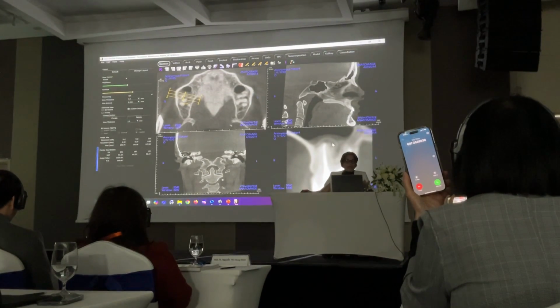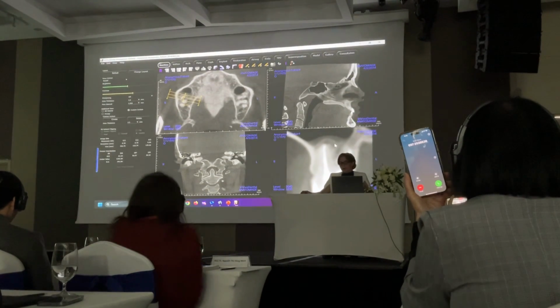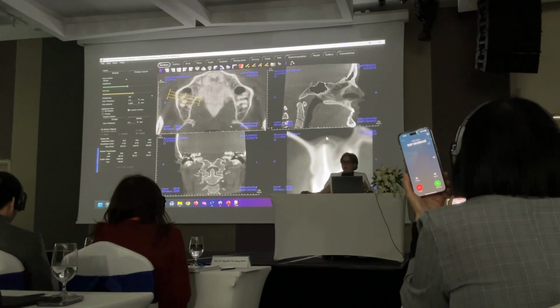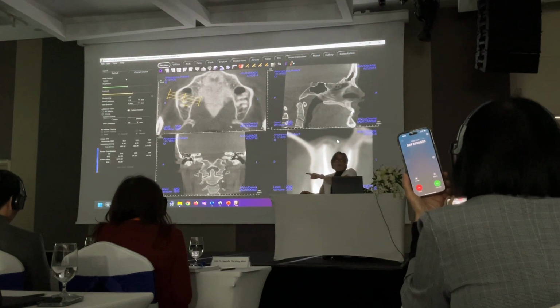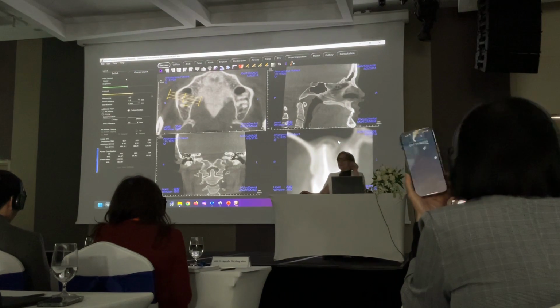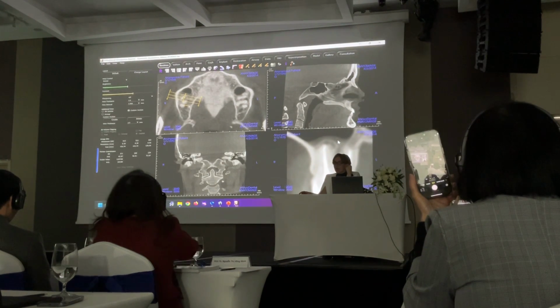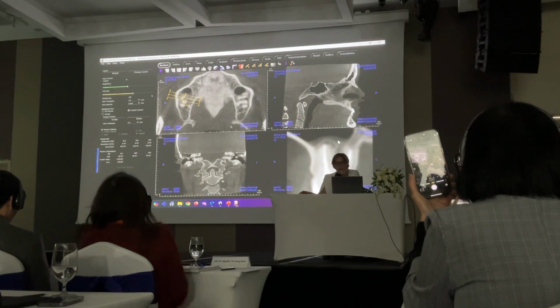New, maybe it's healing. This is lifting the floor of the maxillary sinus. And there is a secondary inflammation of the Schneiderian membrane, okay? This is an important diagnosis for all of you to know, because the ENTs, the ear, nose, and throat doctors, they don't know this diagnosis. Or maybe some of them do.